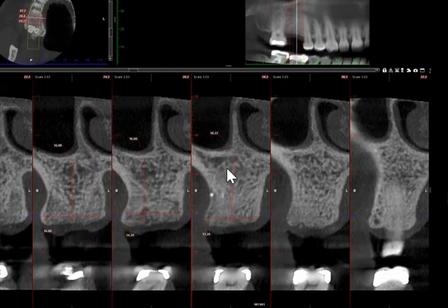Again, the bone quality is nice and great. The ridge is very wide. You'll have no problem placing just about any implant that you choose. In this case, just as a demonstration, I have placed a virtual implant that measures 5 millimeter by 10 millimeter. So the width of the implant is 5 millimeter. And you can see, this is relatively wide. You can obviously find the wider implant that is 6 millimeter. But at 5 millimeter, you have more than enough bone buccolingually. And of course, the height is very generous as well.